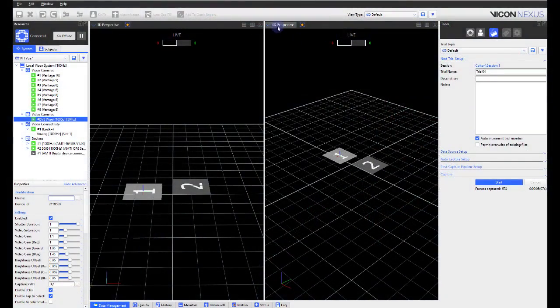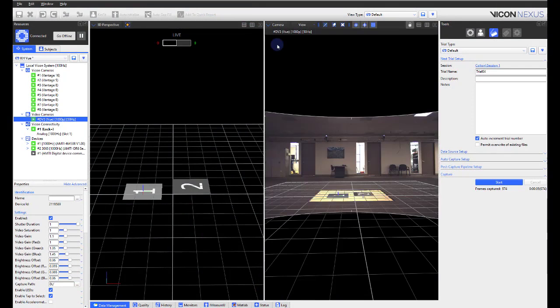Within the video camera view, you can now add a foot strike counter. This will enable the user to get quick feedback on foot contact when watching a video camera view.